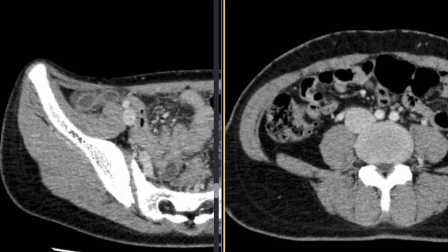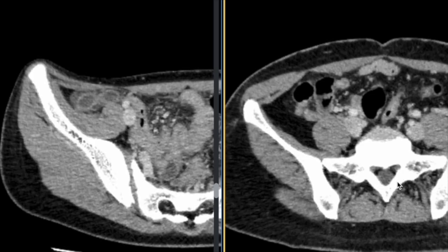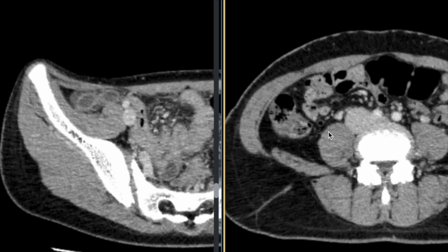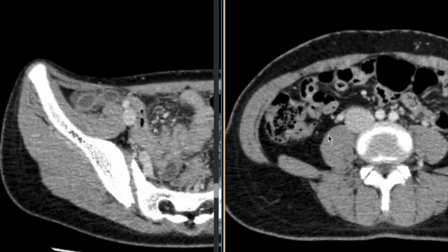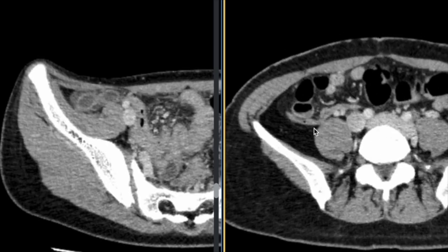Let's compare the diseased appendix with a normal one. Can you pick out the appendix without appendicitis? The answer is this tiny structure here. That's a normal appendix. It varies from person to person, but a non-inflamed appendix is very small. The wall doesn't thicken either.